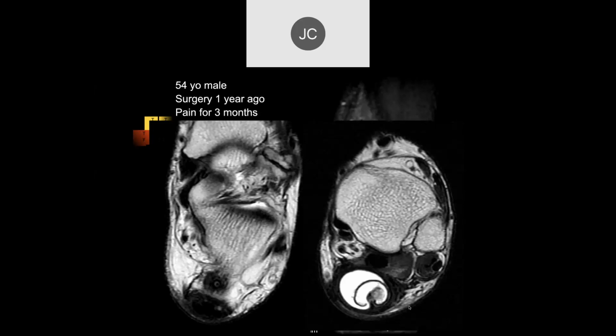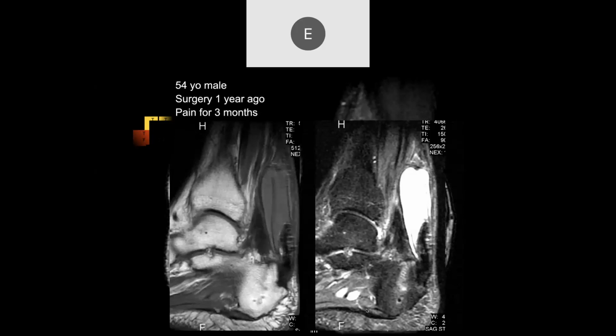We're seeing a lot of signal and fluid within the Achilles, but I think maybe is it another plantaris wrap with the Achilles torn and retracted maybe? Right. And then here's actually the retracted, and the metal here, the tear of the main construct, but there's also a secondary anterior construct here, which is probably the soleus attached to the calcaneus.